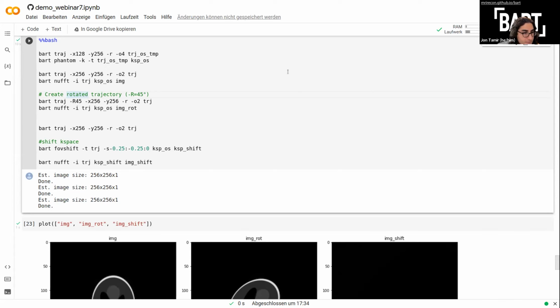All right. Okay, then let's continue. So let's share screen. Wait, can I somehow steal the screen sharing? I just stop it. If you stop voluntarily, then this works better.